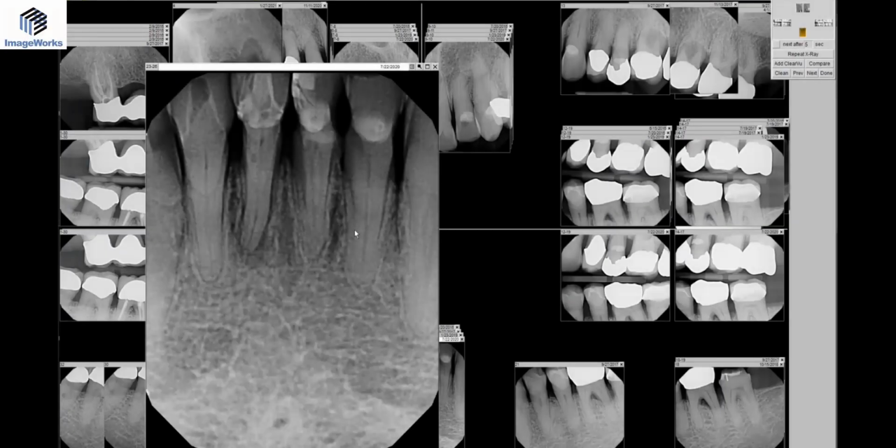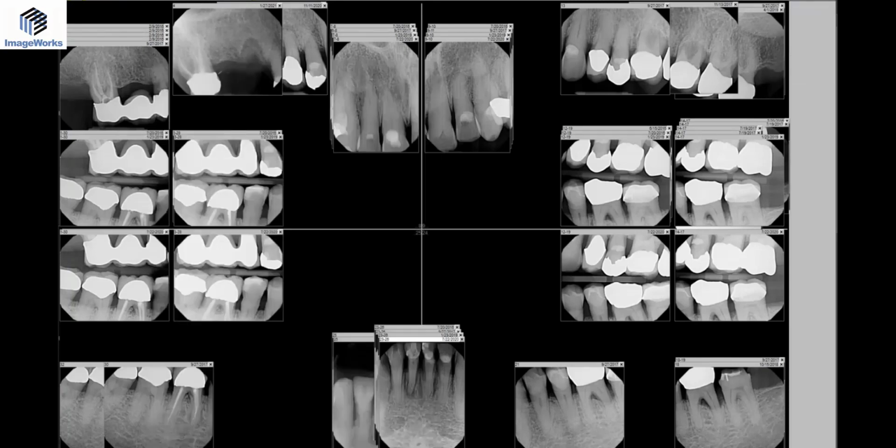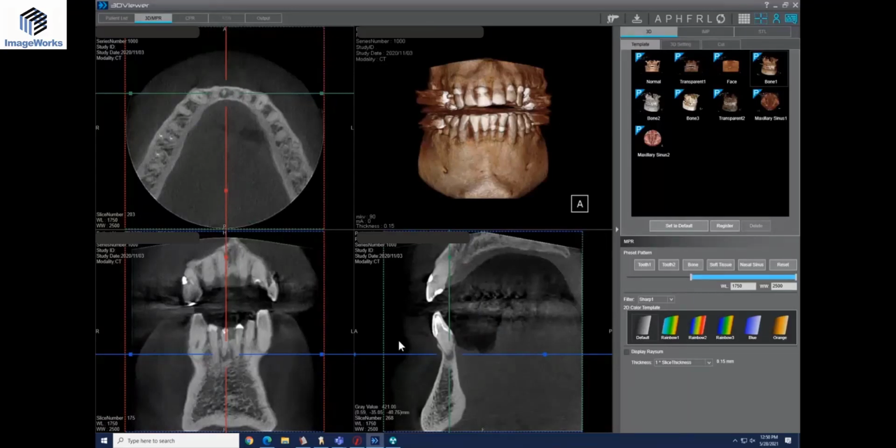I just wanted a better picture of this tooth, and to make sure nothing else was going on. So we did the cone beam. Fortunately, I looked at the cone beam because he basically, as I recall, was asymptomatic with everything. So let's close this down. And there's his infection here on that tooth.